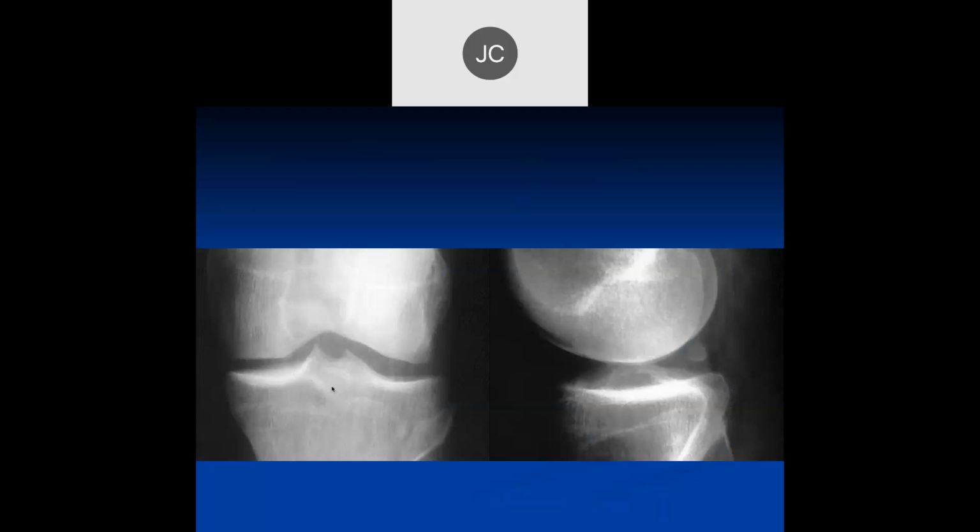All right, we have frontal and lateral radiographs of the knee with an ossicle in the posterior joint space. It could be a loose body or that meniscal ossicle we were just speaking of. It could be either one, but it's right in the area of the posterior horn of the lateral meniscus. You see there, and again, this is what the meniscal ossicles look like on plain film. Nice and corticated, nicely defined, in a characteristic location where the posterior horn should be positioned.